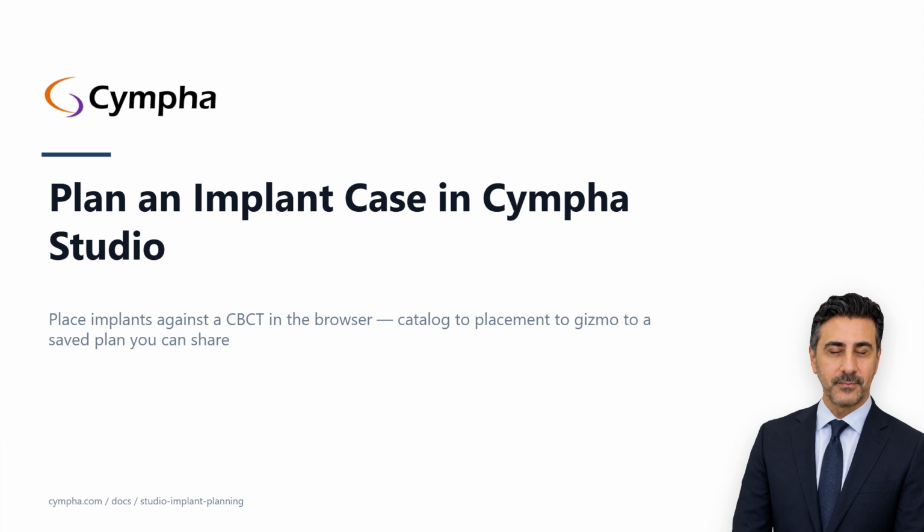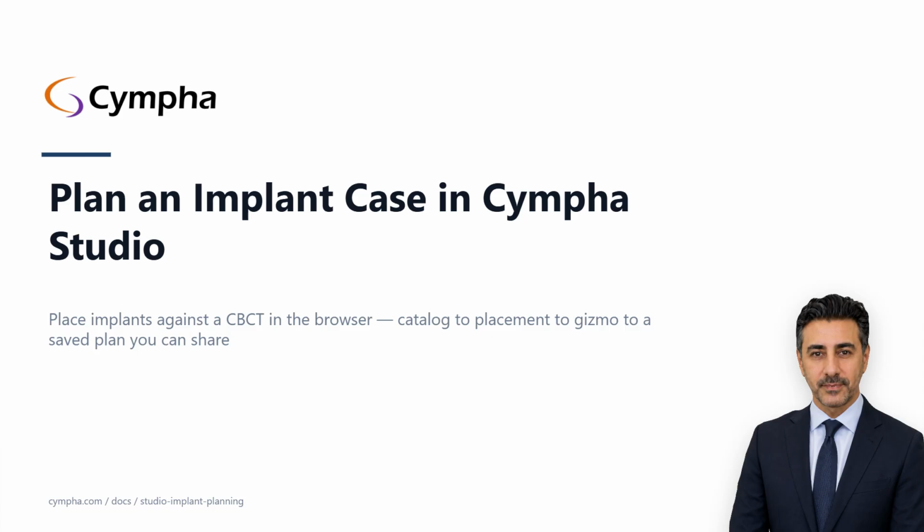Plan on about 15 minutes for your first single implant case, and roughly 2 extra minutes per additional implant once the workflow is muscle memory. Follow along on screen, or listen now and read the written guide later.